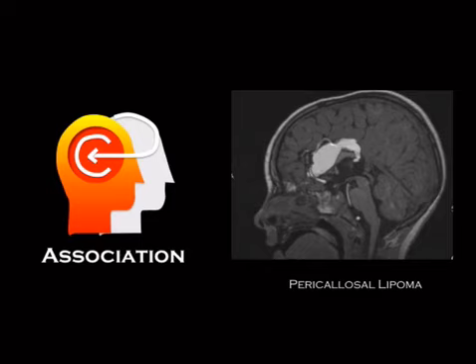They can occur in the IAC. They're typically midline lipomas, that is. You can see them in a suprasellar cistern or pericallosal. This is a good example of a midline one. When you see a midline pericallosal lipoma, you should think about agenesis of the corpus callosum.